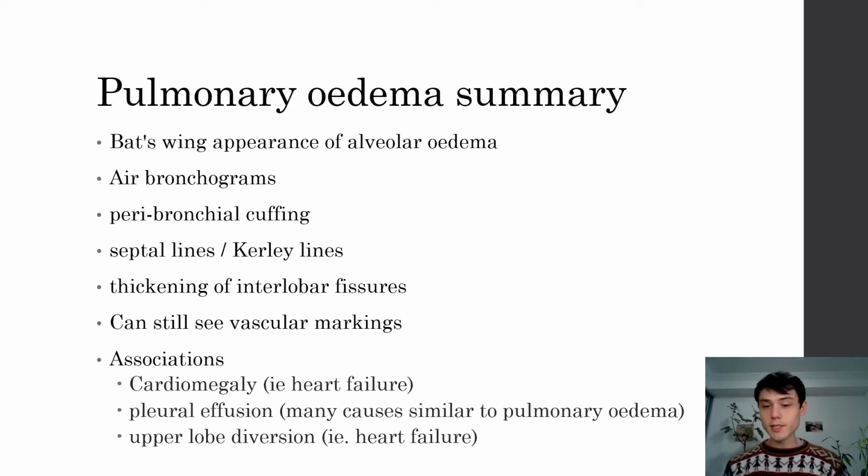There are also some associations we've noticed. So in heart failure, sometimes you get cardiomegaly. Pleural effusion is associated with many things that also cause pulmonary edema. And upper lobe diversion can also be a feature found in heart failure.